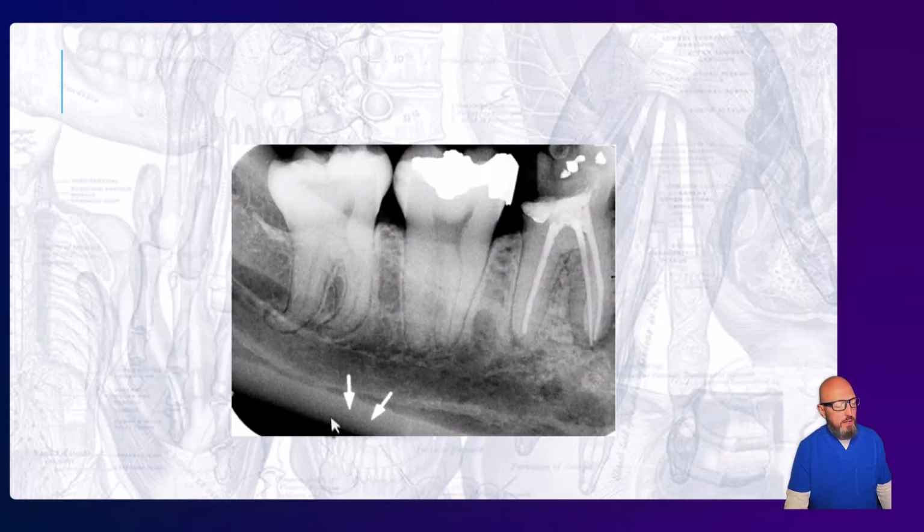Then you won't see this very often in intraoral radiographs unless it's taken somewhat steeply from below, but that's just the inferior border of the mandible, so be aware of that.